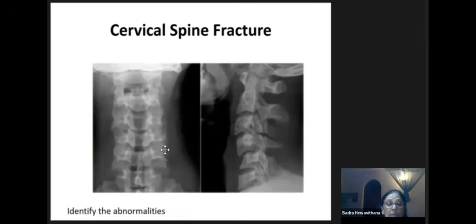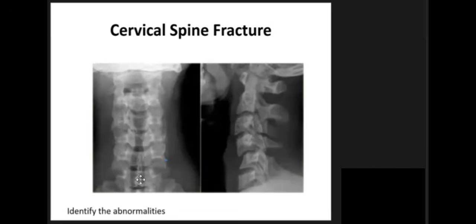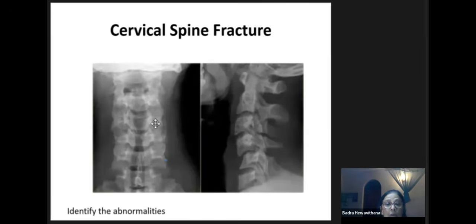You can see the cervical spinous processes very clearly, because in this area we see the trachea and the pharyngeal air column. I don't know whether you could appreciate these two. You don't see the spinous process particularly here. You see the spinous process below, but you don't see it here. So if you don't see the spinous process in a cervical spine AP X-ray, you may be looking at a serious trauma.